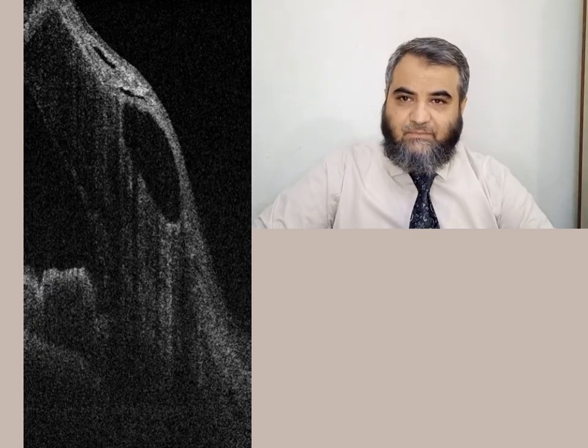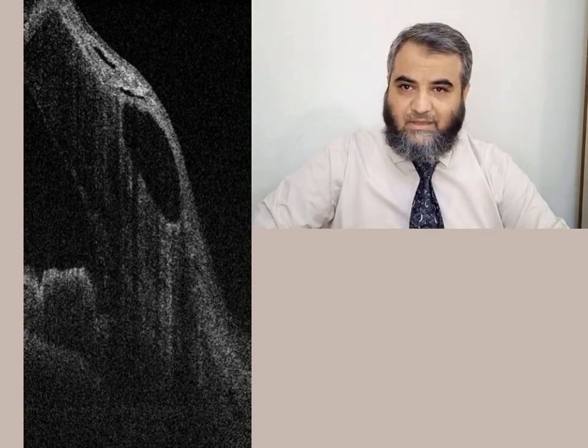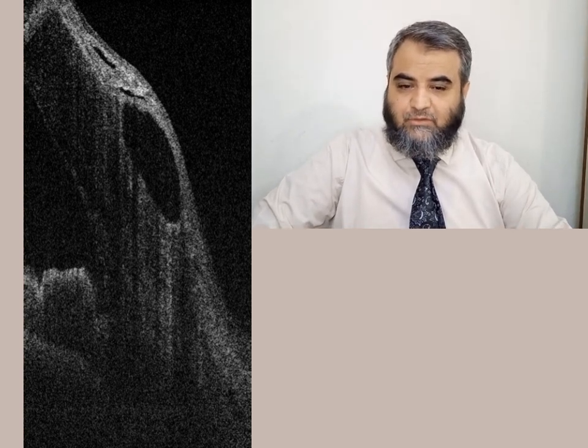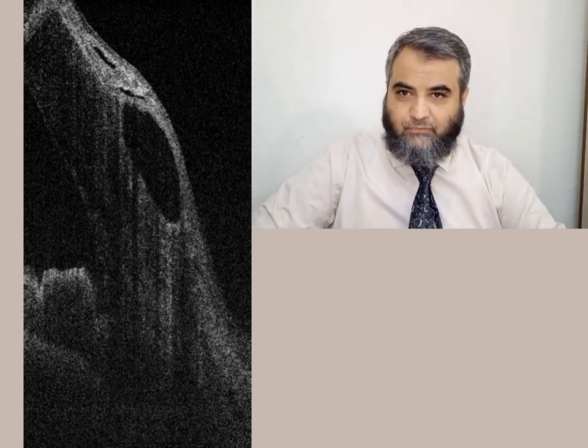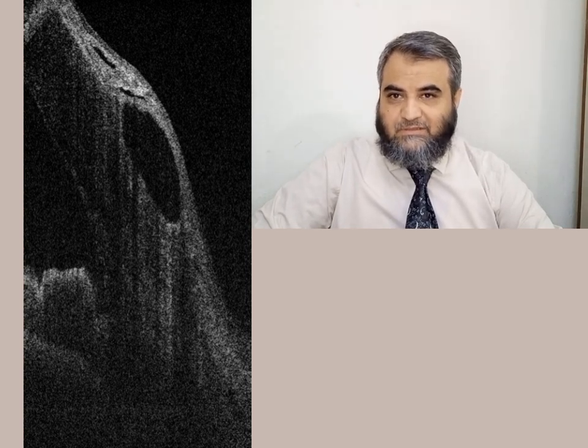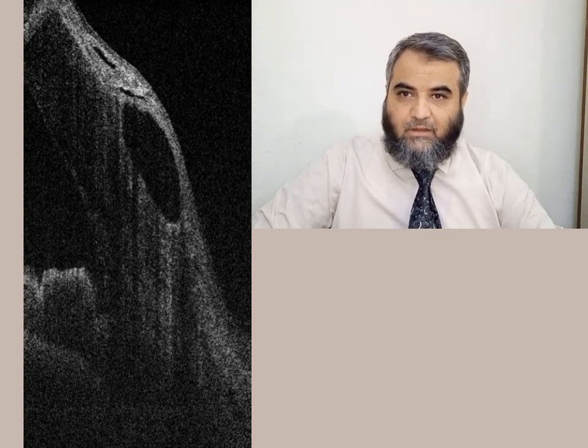This is again the same, magnified as I told you. Here again you can see the elevated lesion of conjunctival papilloma with small vascular cores superiorly, and the same continuity. Basically it is the same magnified portion of the OCT anterior segment.